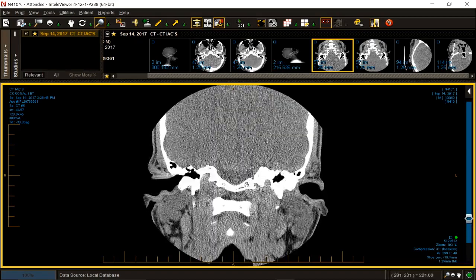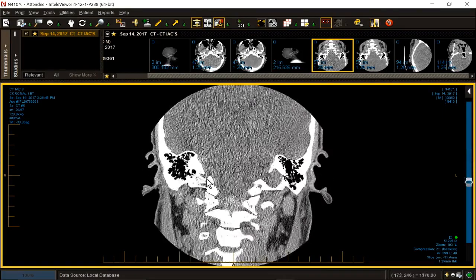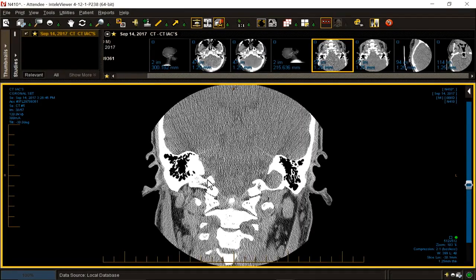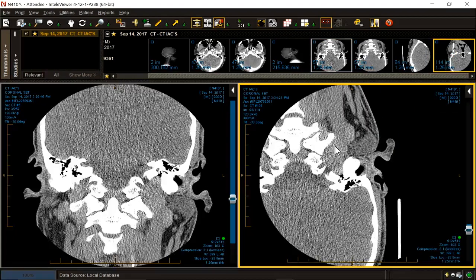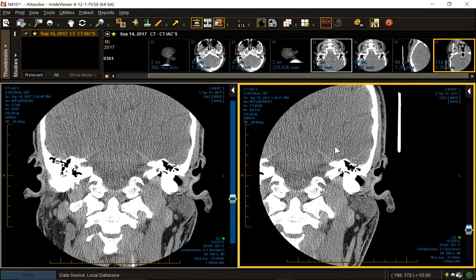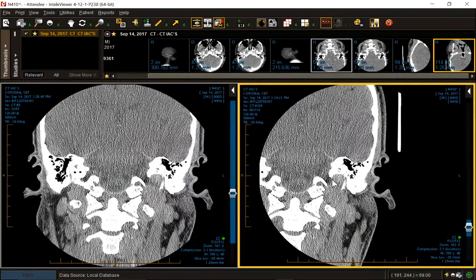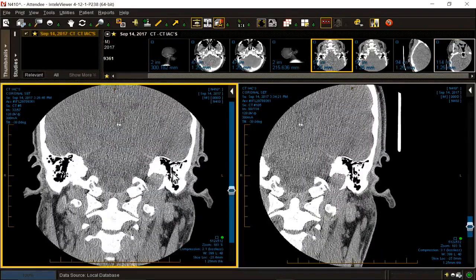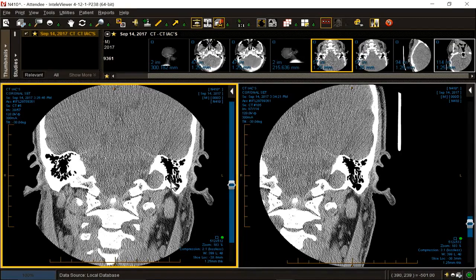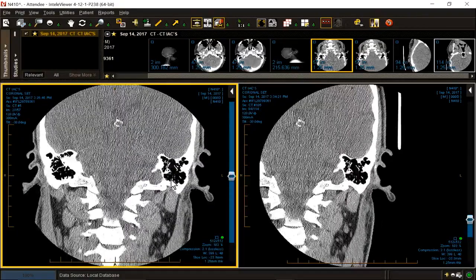So here are the carotid canals. It's not the most aesthetically pleasing CT I've ever seen. But I would say that's a very patulous and slightly high-riding jugular on the left, especially compared to the right, wouldn't you? And that really was the only finding that we could come up with in this individual. So it was a diagnosis of exclusion.